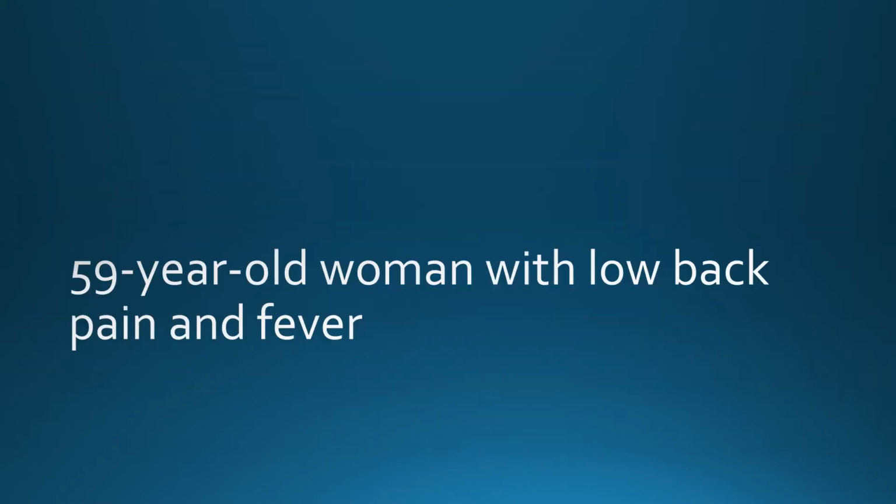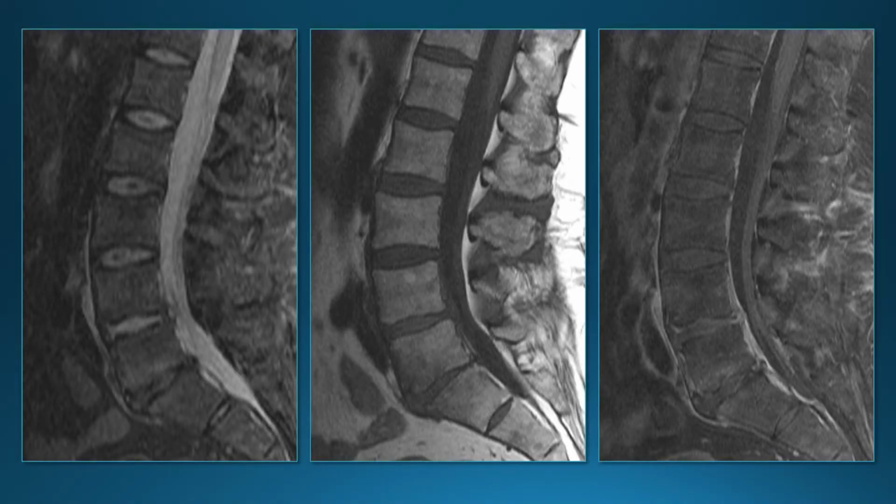Okay, next, 59-year-old woman, low back pain and fever. So it sounds like a good history for infection. The infectious disease specialist saw this patient, was very concerned about infection based on the clinical presentation. When we looked at the MRI, it was not that convincing. So do we see any signs of infection here?